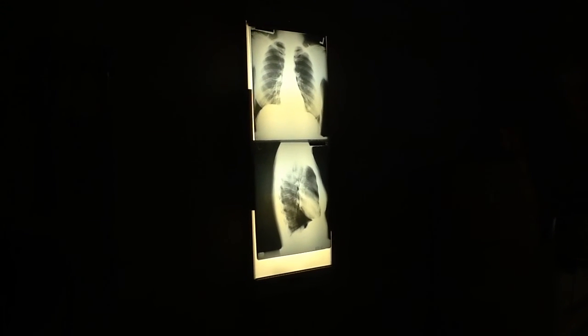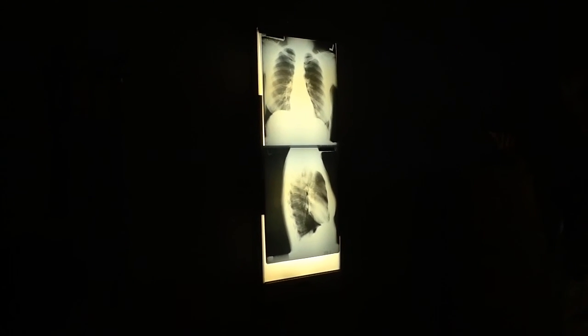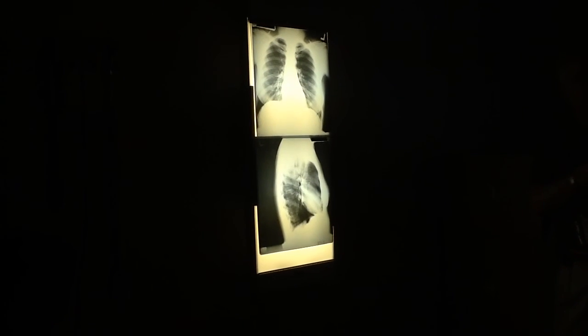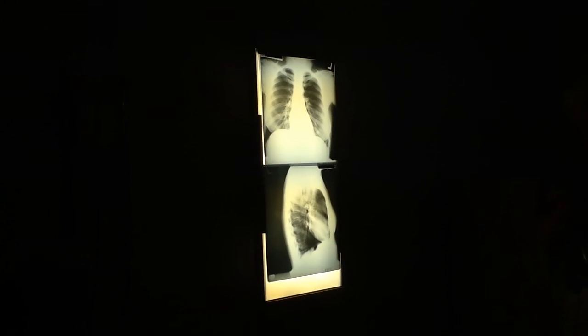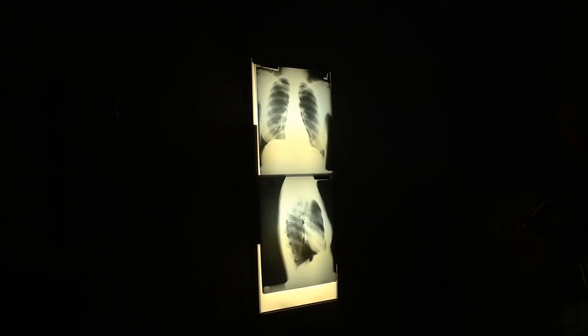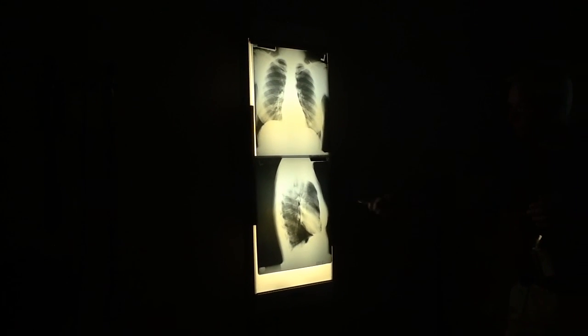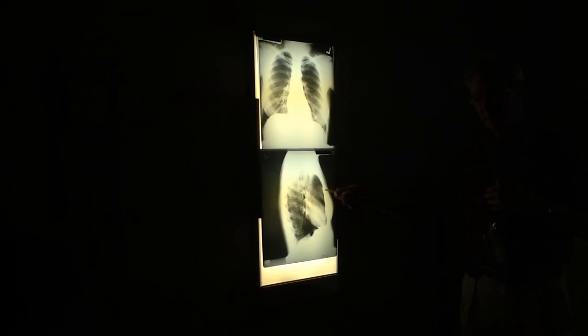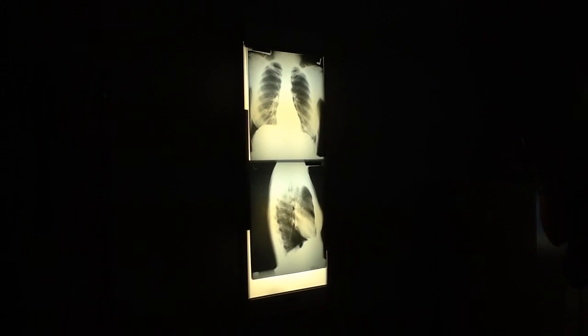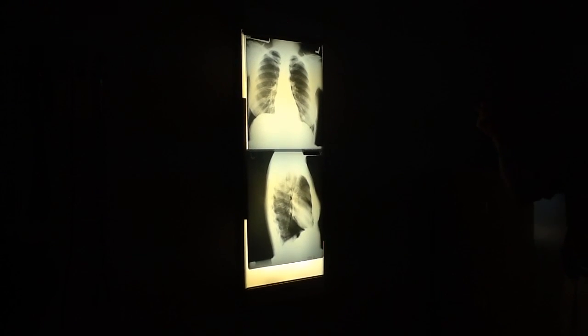And so if a patient is diagnosed with MG, they scan the chest and see if they have a thymoma. And if they do, they surgically remove the thymoma because it slows down the progression, it improves the myasthenia gravis. So there's a relationship, but it's not a 100% relationship. So this proved to be a thymoma. And that is one of the features of thymomas. They may enlarge more front to back and not much side to side. So they may not be visible on a frontal like this one.